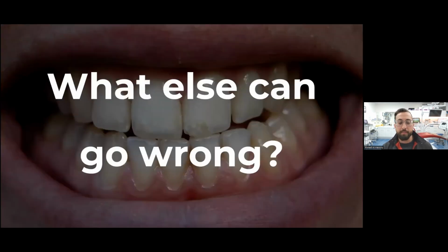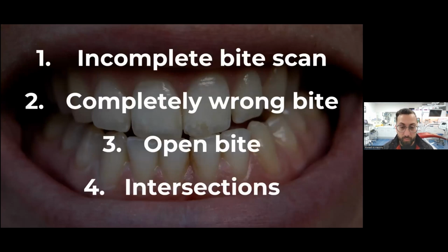Now, then becomes the question, what else can go wrong? Apart from the obvious thing where the patient isn't biting properly, what are the 4 things that can go wrong with a bite scan? Because in my eyes, bite scans are pretty easy to do and they're pretty easy to troubleshoot. And really, this is the 4 things that can happen. And this is really the only 4 things you need to think about, in my opinion, when taking a bite scan. These are the things you need to check.